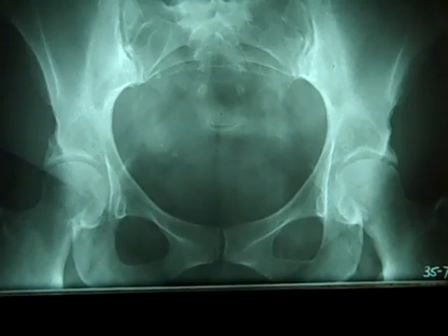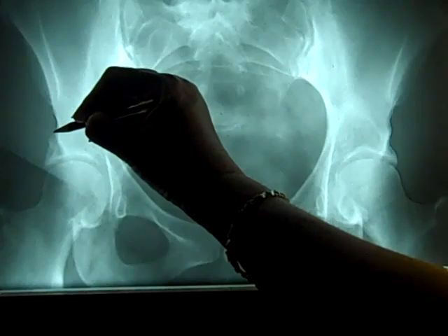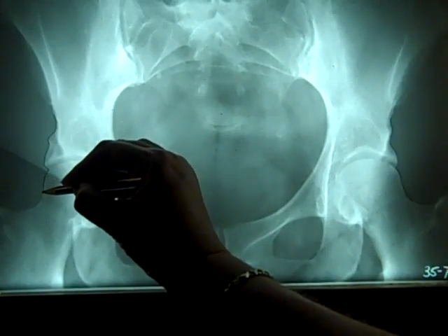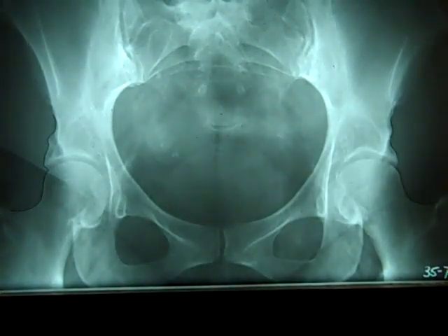It is drawn along the lateral margins of the ilium, and so you just come down and trace it out, and then a joint space, femur head, neck of the femur to the greater trochanter. And then you go over to the other side and you look along the ilium, across the joint, femur head, femur neck to the greater trochanter. And so you basically are looking at that side to side, and you're looking for there to be a symmetry between the two sides.